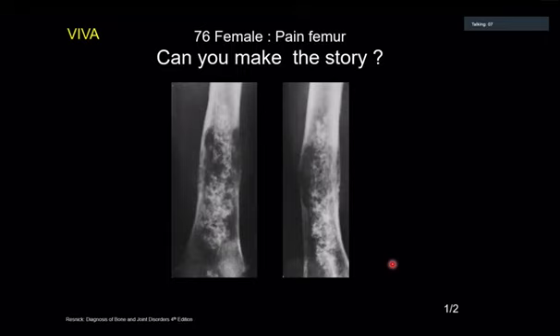There are also serpiginous geographic areas of calcification within the central medullary cavity. There's also expansion of the central medullary cavity and a breach of the cortex on the lateral images. There's also some periosteal bone reaction as well, especially evident on the lateral X-ray.